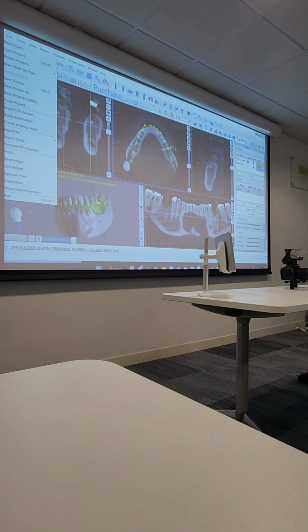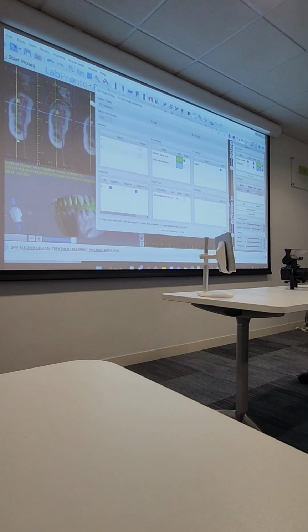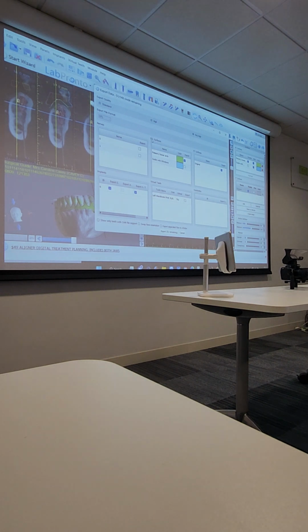I never had to do it. So you can export the CT, make a 3D model of someone's jaw, couldn't you, to show them what the jaw looks like as a demo? Why don't you want to do that? Just out of interest to see what it looks like. Must be a way. I can't see it here though. Oh yeah, hold on. Here you go. Yes, CT surfaces. So you need to untick this, untick this, untick this, and you just export this. So yes, you can.